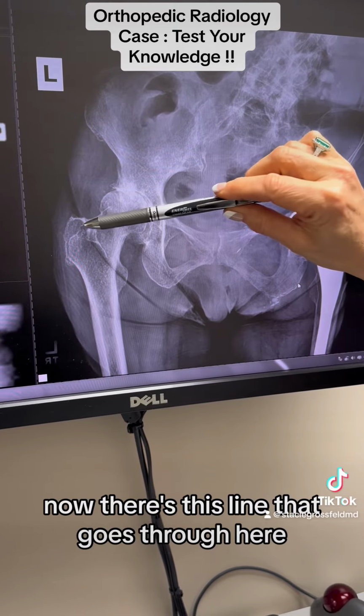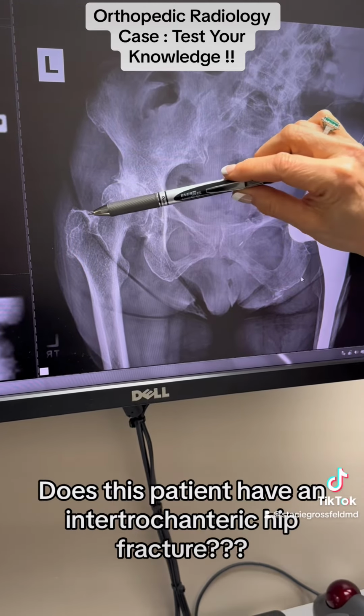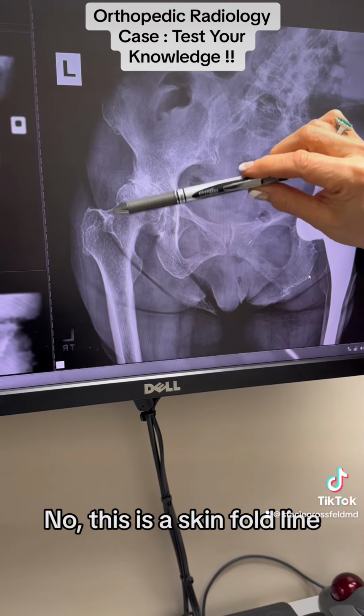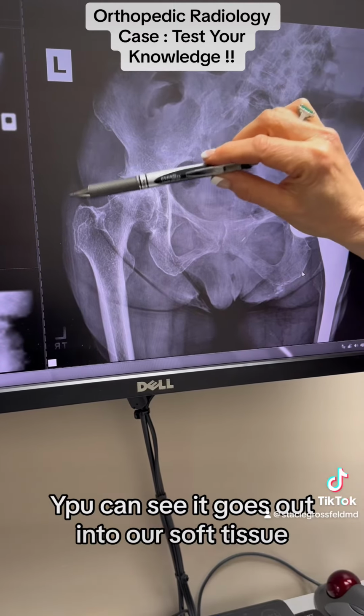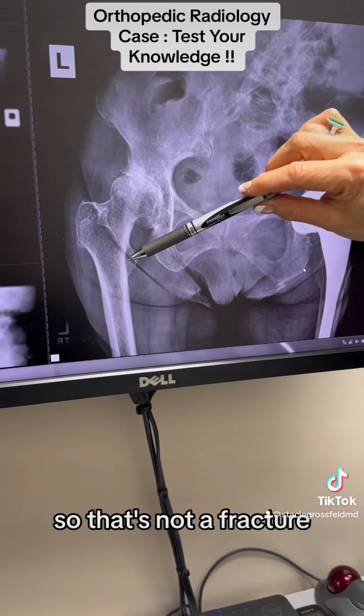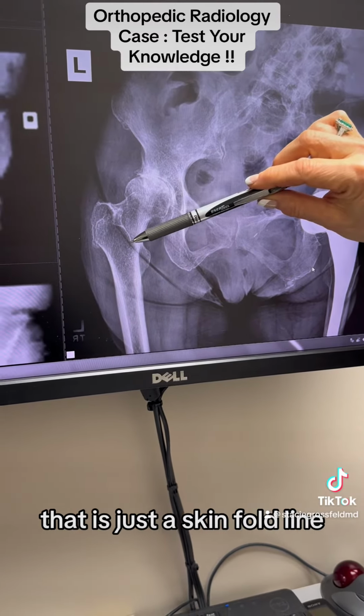Now, there is this line that goes through here. So does this patient have an intertrochanteric hip fracture? No. This is a skin fold line. You can see it goes out into her soft tissue, and there's continuity of the line through here, so it's not a fracture, that is just a skin fold line.